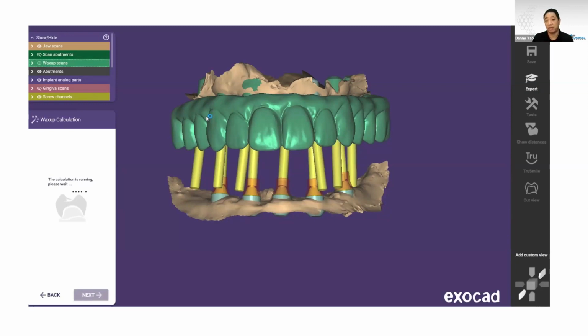And usually you have to end up scanning the tissue with the prosthesis or the temporary prosthesis in order to do those alignments. And that's a much less accurate bite scan, especially for these finals, than scanning the scan caps that we have. They're all rigid. You can scan them outside the mouth, and they're really easy to place. You don't have to screw them in.